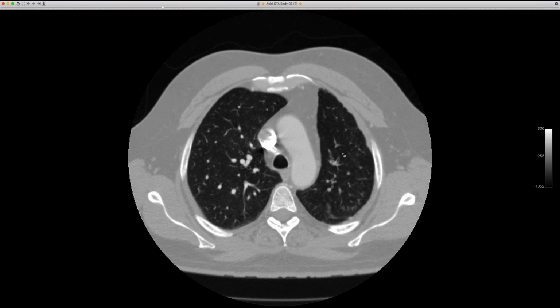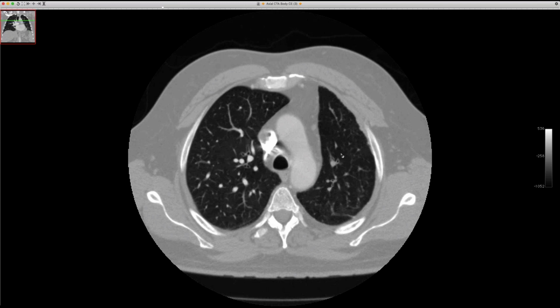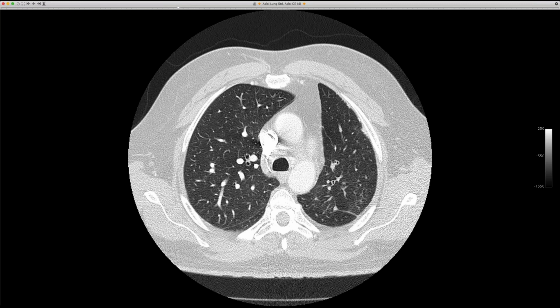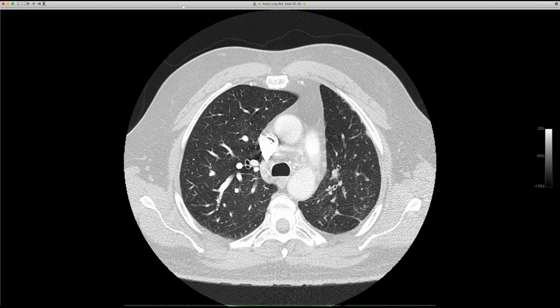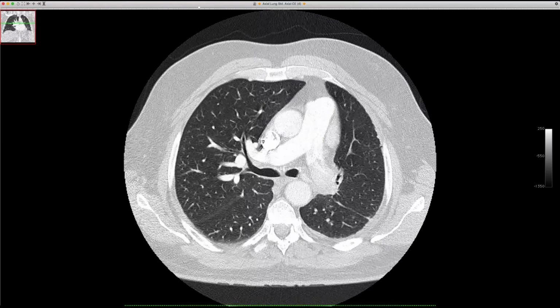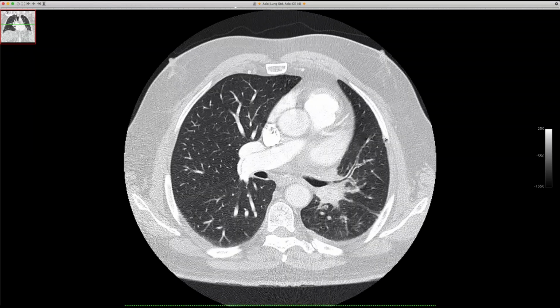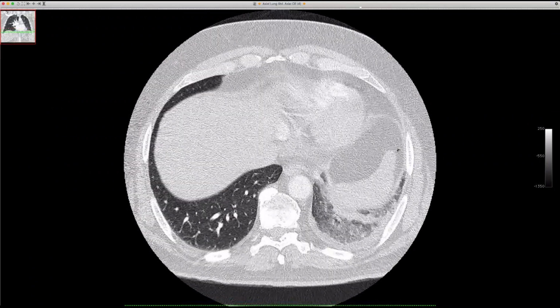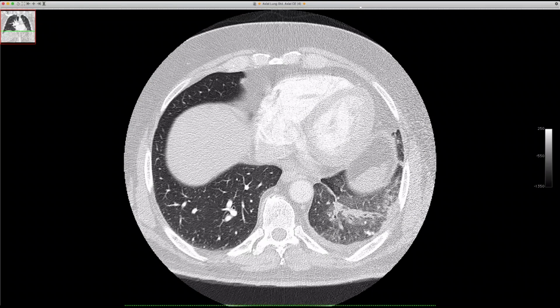I'm just curious, if you look at the pleural surfaces, which may be thickened, do we see any dots there to suggest that systemic wall vessels are trying to come in there and help out with the lung? Yeah, hard to say. Transpleural collaterals, you can probably see a few going up there. Oh, there are little dots there, yeah. So one could speculate that's what they are, transpleural collaterals. Yeah. And there's the original histo lesion right down here.